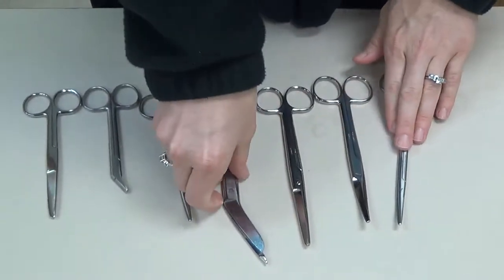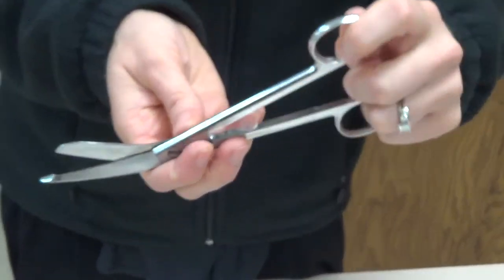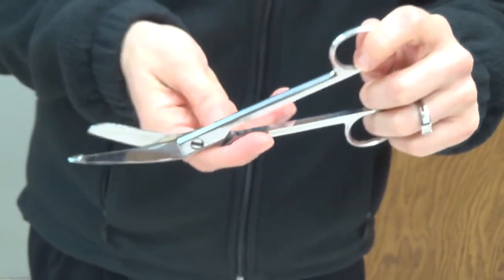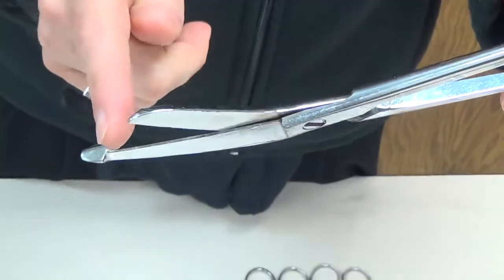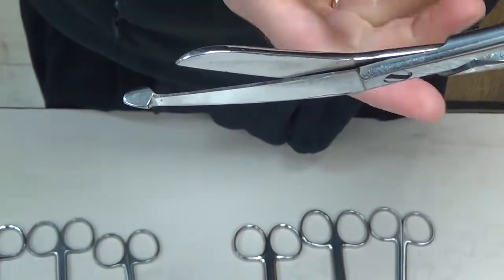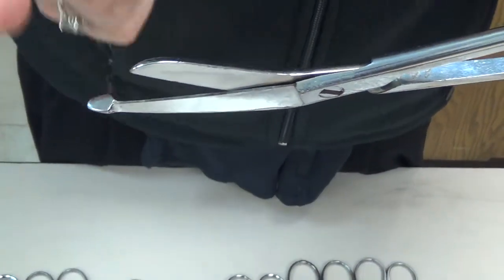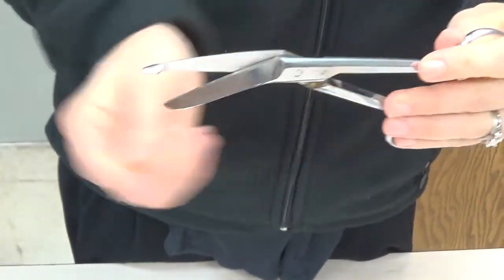Okay, another scissor that we have is referred to as a bandage scissor. So it can be utilized to cut bandages or cut the dressings off or remove the drapes at the end. It's going to have this blunt edge on it that will help to protect any injury to the patient's skin as we cut underneath a dressing in order to remove a dressing. Of course, we would want to utilize it in this position instead of this position, because then we would be poking into the patient's skin.